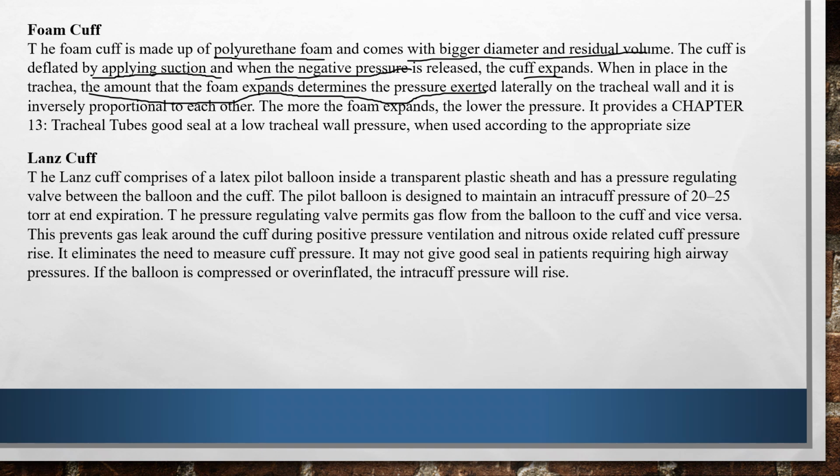The more the foam expands, the lower the pressure, and the tracheal tube has a good seal at low tracheal wall pressure when used according to appropriate sizes.